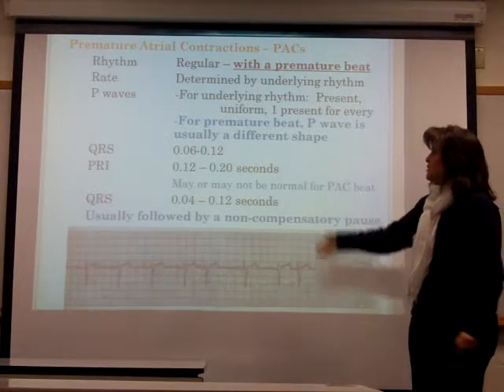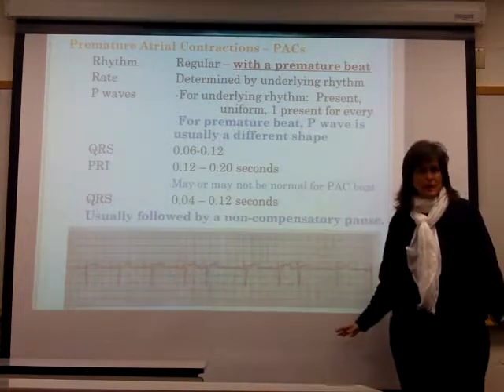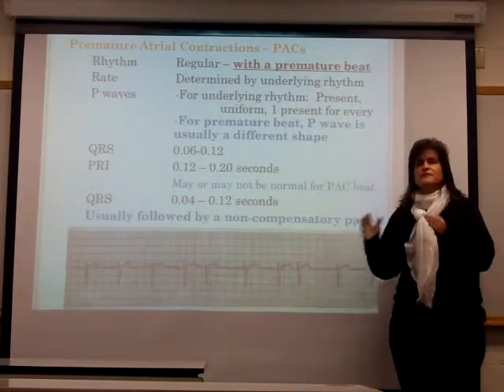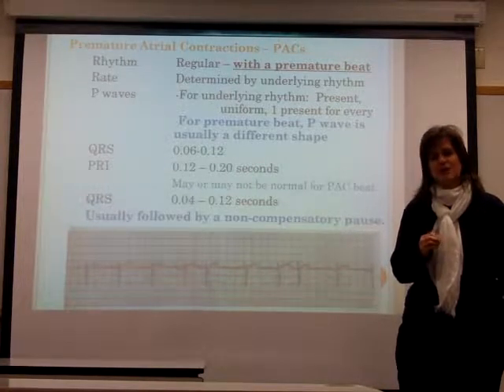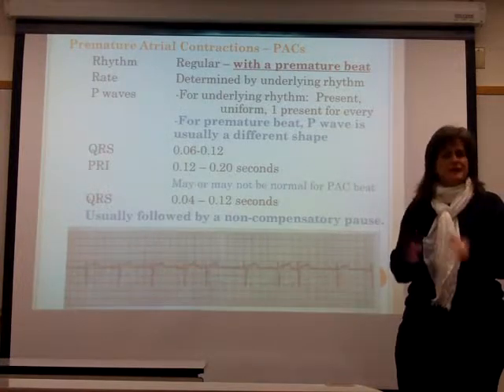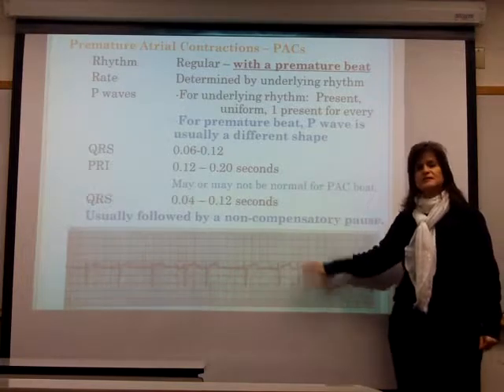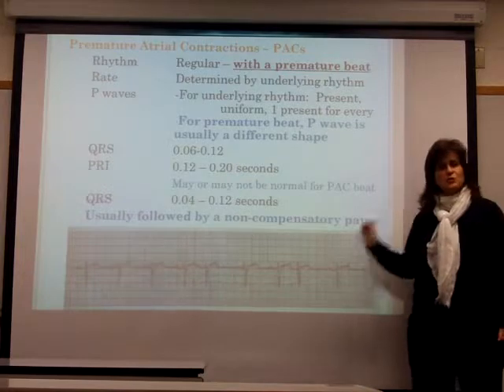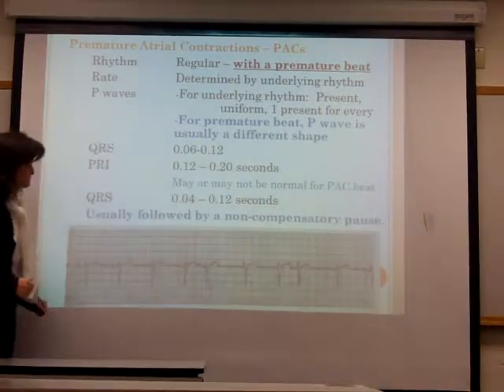Okay? So when you're talking about rhythms that include PAC, it can be any kind of underlying rhythm: normal sinus, sinus bradycardia, sinus tachycardia, whatever. The faster the heart rate is, though, the more difficult it is to see if the beats are early, because as the EKG squeezes together, typically things start to look a little more regular. But these are yet another reason why you have to start from the left side and work all the way over to the right side in order to get a good interpretation. So let's look at this particular slide.